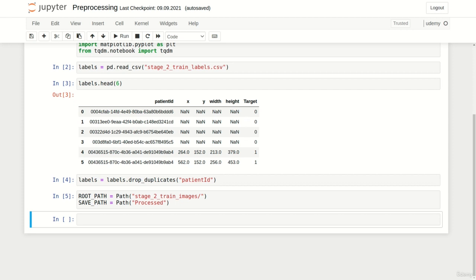Now it is time to look at some example images. To do so, we create a 3x3 subplot to visualize 9 X-ray images paired with their corresponding labels. At first we create the figure and axis objects and then use plt.subplots.